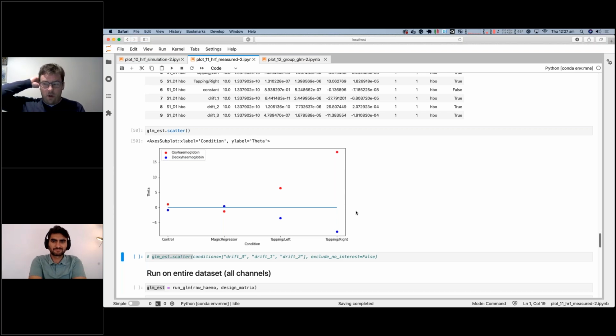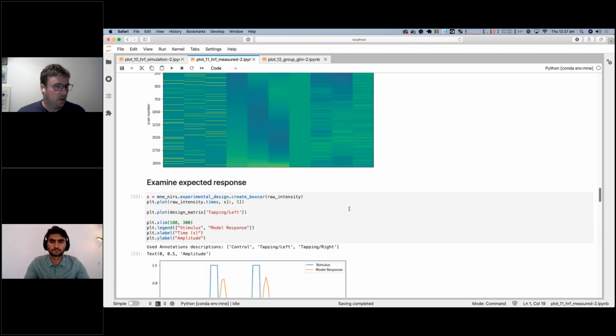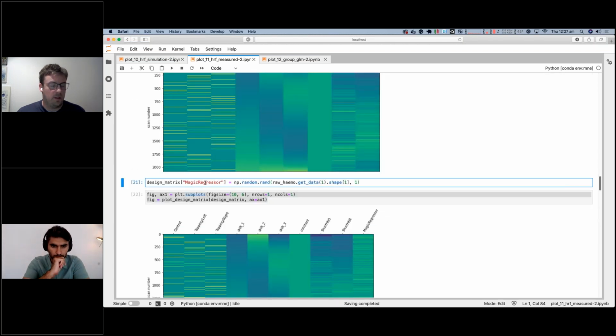It's in progress. At the moment, it just reads in the data. I'd hope in a couple of weeks that it would also read in the accelerometer data. If you read in the accelerometer data in a separate step, then you would use something like my magic regressor here. You would just say accelerometer X or something, and pass in your variable here. At the moment, no, I haven't programmed in a reader for the accelerometer, so I'll add that to the to-do list. Actually, that's a good point.